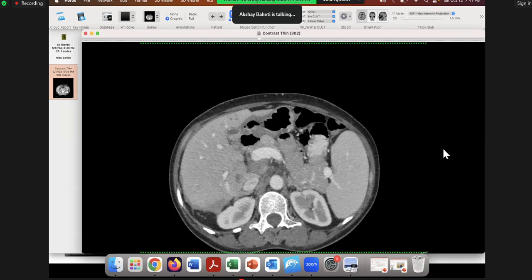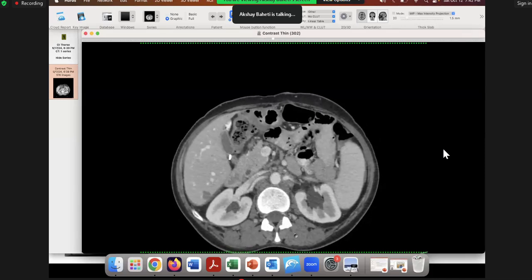In that case, you are more worried if it's the drainage area, right? Otherwise, I would always ignore mesenteric nodes. The other case, of course, is when they're obviously huge, like lymphoma, where nodal adenopathy is very obviously abnormal. But if I see nodes which are prominent, not more than that, I will always ignore them in the mesentery.